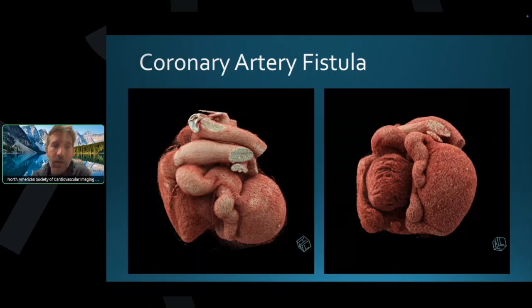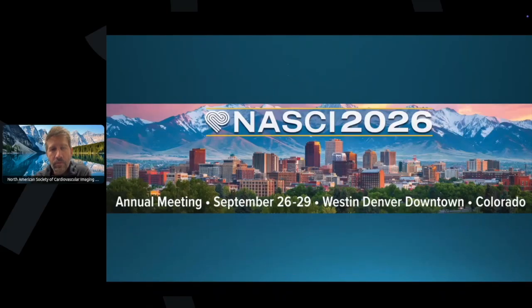I've shown this case in many lectures. Massive coronary fistula draining from the circumflex. So this is a circumflex coronary artery draining into the coronary sinus, and this is a very, very dilated coronary sinus. And that's all I have.